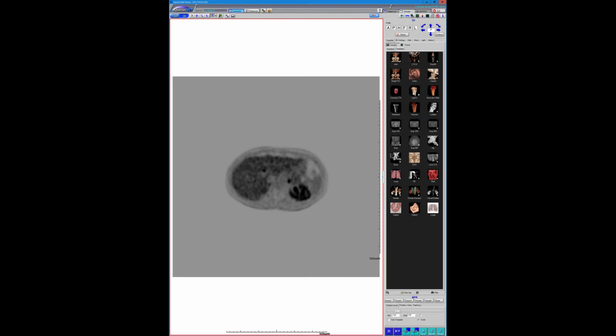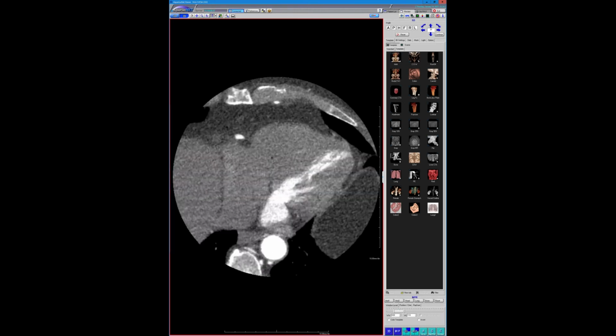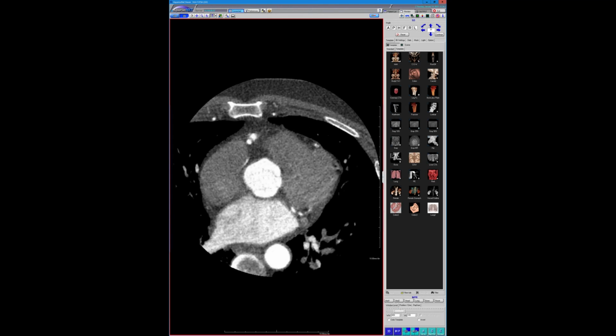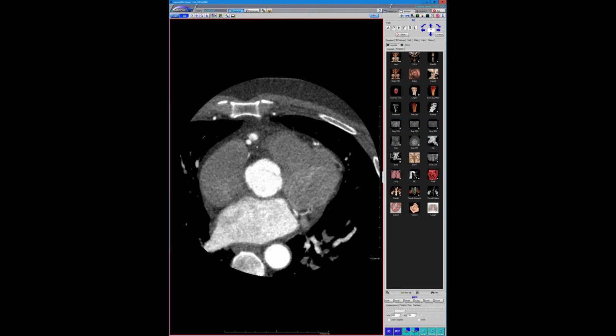And it turns out that they did an F-DOPA PET, which is what you want for paragangliomas. And this thing is red hot on the PET. And then here's the neck thing. So this was a paraganglioma around the coronary in some guy with one of these metastatic paraganglioma syndromes, or the multifocal paraganglioma syndrome. So I thought that was pretty crazy.